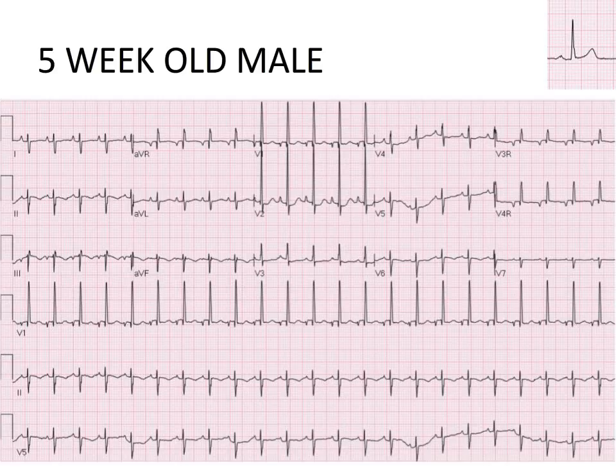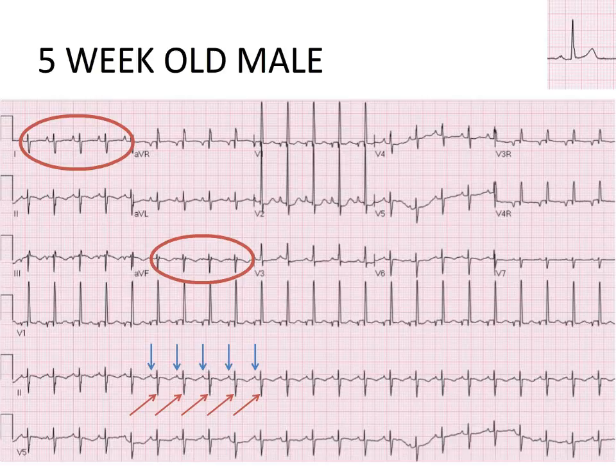Let's use the method we learned in our basics module to go through this EKG together. Calculate the rate, rhythm, and axis. Type your answers in the box and hit the submit button. You should have found that the rate is a little under 150. You can see a P for every QRS and a QRS for every P, so this is sinus rhythm. The QRS complexes are down in 1 in AVF. This means that the EKG has a northwest axis, which is the classic finding for an AV canal defect.